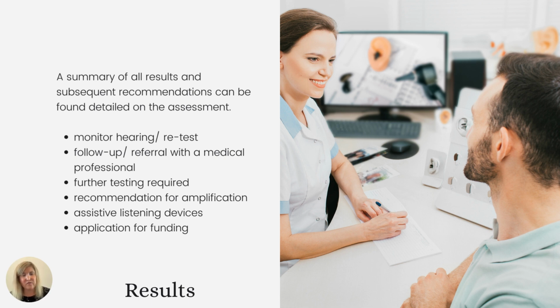And finally, there will be a summary of the results indicated on the hearing test. Some common comments can include that the examiner would like to continue to monitor the student's hearing over time. They may also ask for a retest at a later date once wax is removed.